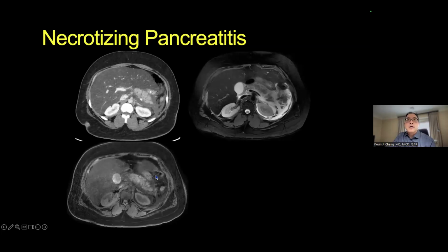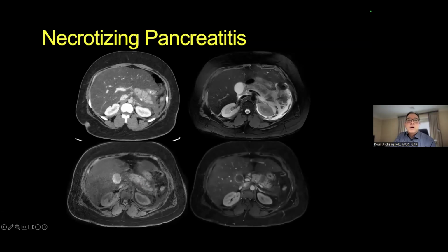And then on the pre-contrast T1 weighted images, you can see there's intrinsic T1 hyperintense signal with a little bit of heterogeneity in the tail, kind of subtle, but much more obvious following contrast administration, where in the pancreatic body, you're seeing this area of non-enhancement, which in retrospect, looking at that T2 weighted image again, correlates to an area of subtle T2 hypointensity.